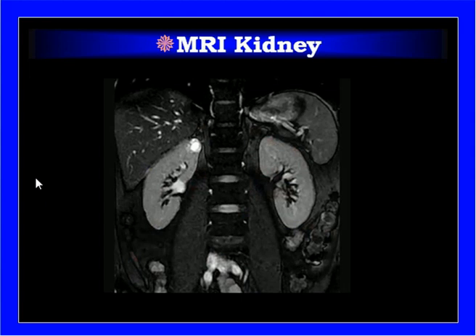Now this is MR image, coronal image of the abdomen, which shows the kidneys, and here you can see clearly the different organs having different intensity. You can see the kidneys, liver and the spleen, and a rounded bright structure in the top of the right kidney is actually a simple renal cyst.